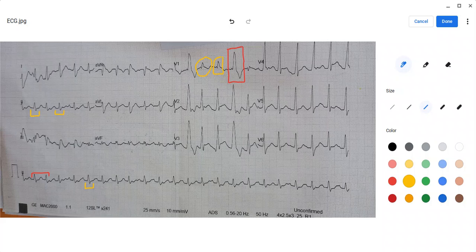Also, because this patient had a past history of ischemic heart disease and he presented a very typical presentation of myocardial infarction, we need to rule out the typical findings of myocardial infarction. Either find them or rule them out. If you look closely, although it is not very easily visible, because this is the most important finding we need to look for, look here: the ST elevation, very clearly visible in this wave, although if you look throughout the ECG you will have difficulty finding it.